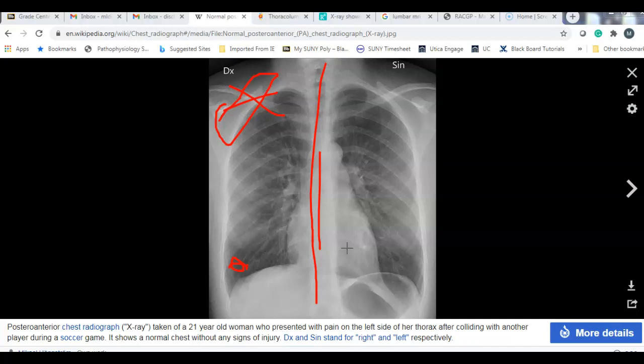Soft tissue you could definitely see. You want to look at the lung fields. You want to make sure the trachea looks patent and open, and look at the soft tissues. When I look at this, your diaphragm will be here. There's some sort of bubble here, which is kind of interesting. They don't make a note of that. Maybe just a gas bubble, perhaps. Okay, but anyway, you want to go through and look at all of those.